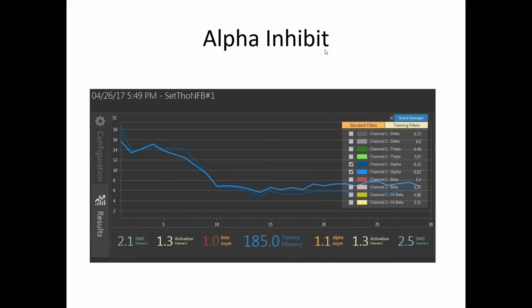This is a basic trend screen, whether you're in BrainMaster or NewMind, and even Thought Tech has trend screens along this line. If you use BioExplorer, you can produce trend screens along these lines. It's kind of a standardized trend screen.